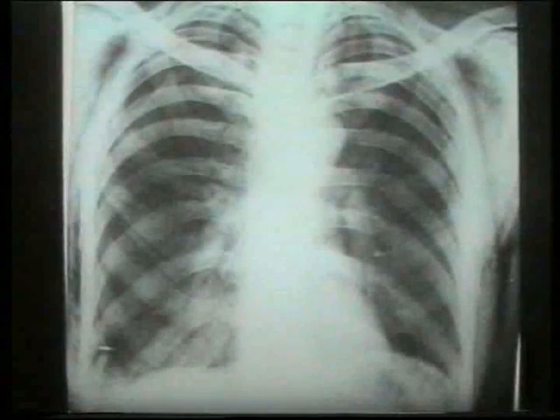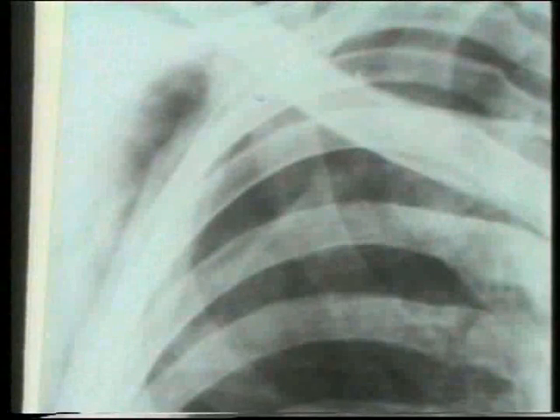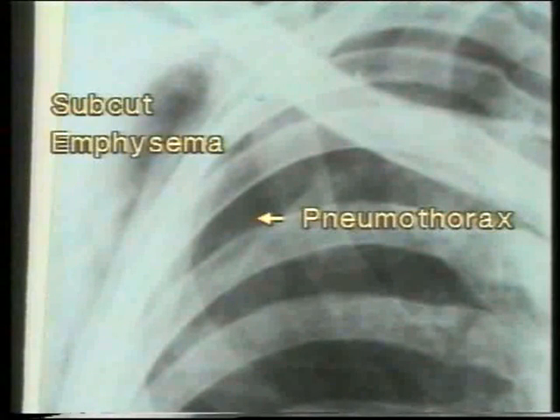This X-ray shows surgical emphysema, which results from a pleural tear secondary to rib fracture and leakage of air into the subcutaneous tissues. Note the fibers of pectoralis major that are so clearly lined by the air, and the air in the subcutaneous space surrounding the chest wall. A careful inspection shows a small pneumothorax and border of the partially collapsed lung.